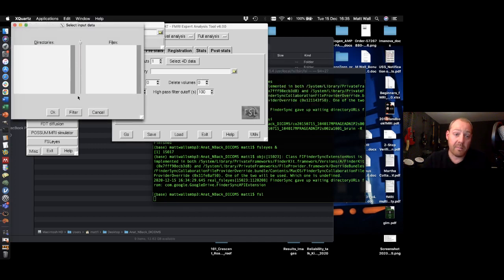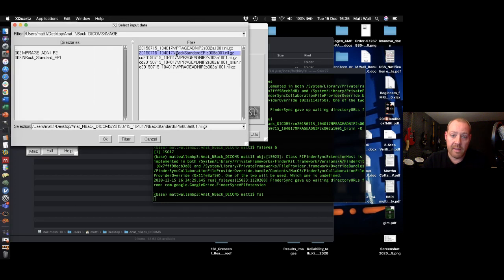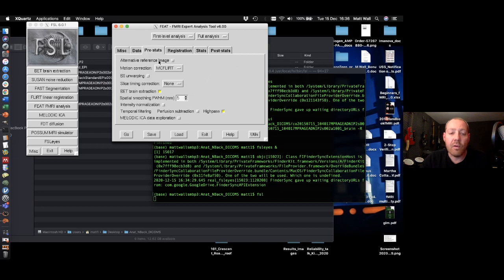First of all, I'm going to put in my functional data, which is there. I'm going to give it an output. Oh, it always says that. That's fine. I'm going to give it an output directory name. I'm going to call it NBAC analysis. Then we move on to what FSL calls the pre-stats, what I call pre-processing in my presentation. It's the same thing.